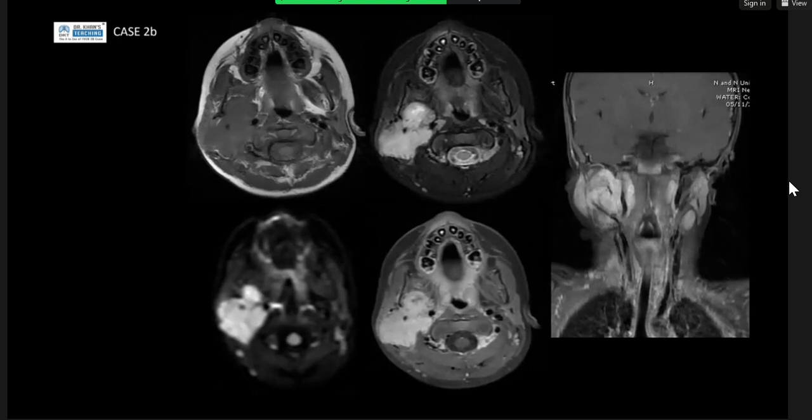I didn't think you said lymphadenopathy. You said salivary gland tumors. Again, I'm not sure they happen. They do happen in kids, but it's not one of the common ones that happens in children. You also mentioned stuff like a carotid body tumor, but often they have this salt and pepper appearance, which I'm not seeing here.